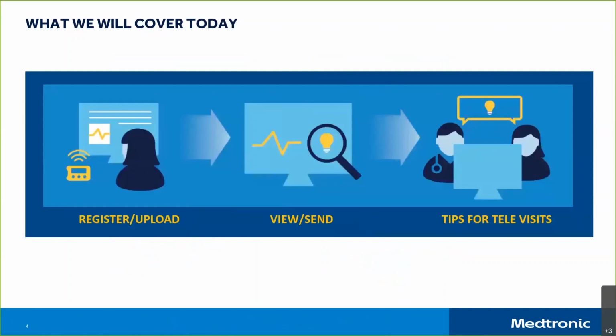Today, we will walk you through how to register for CareLink personal software, how to upload your pump information, and different ways in which you can share your report with your provider. We will also share some tips to help you prepare for your next televisit.